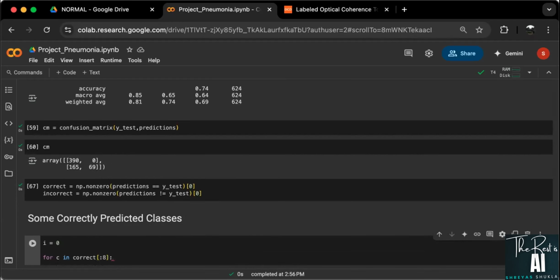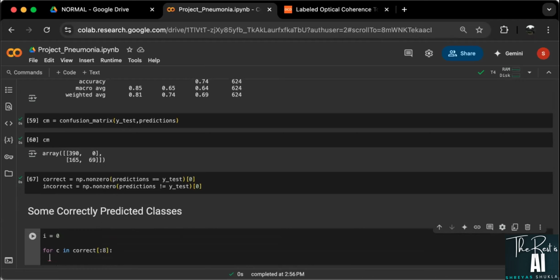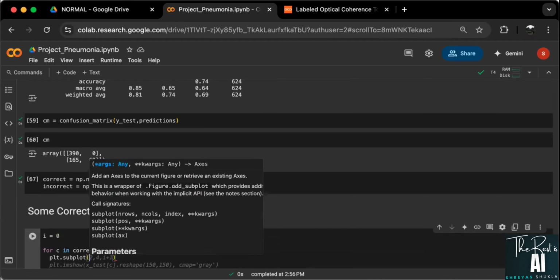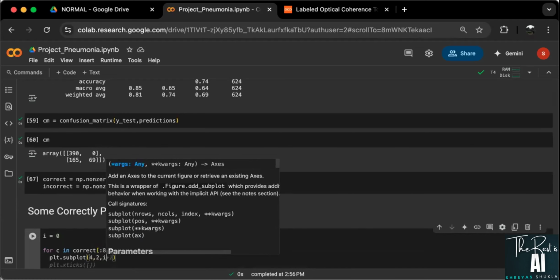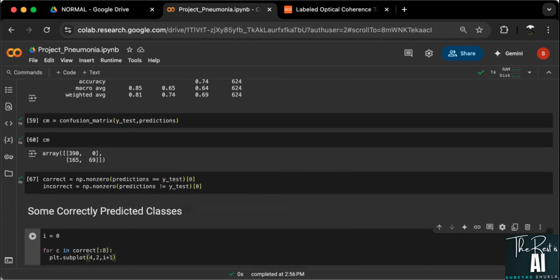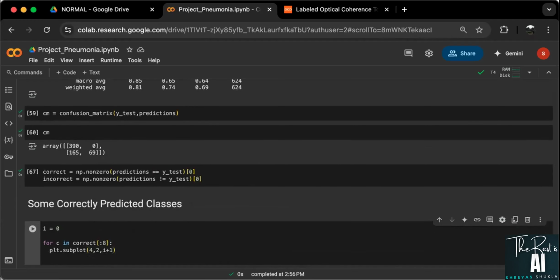All right, and I'll say that subplot, this is going to be, maybe I'll put 4,2, i plus 1.